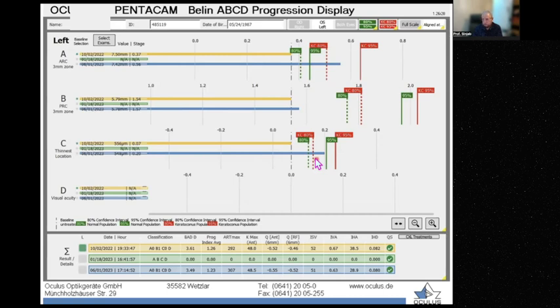So there is a progression. Or maybe you will find only one parameter that jumped beyond the 95%. Any one that jumped beyond the 95%, even if it is a single one, then there is progression. So either two beyond 80 or one beyond 95. So in this case, two beyond 80. So there is progression despite what we saw.